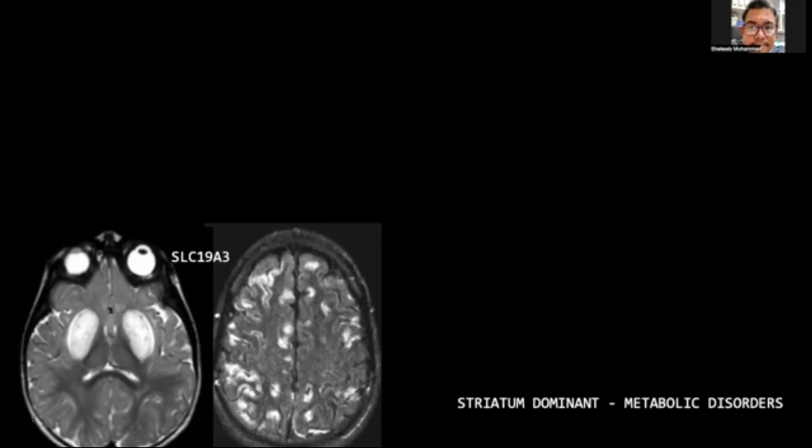In terms of the neostriatum, we have looked at some encephalitic examples, but what about neurometabolic disorders that have a predilection for the neostriatum? An important one to remember is biotin-thiamine responsive basal ganglia disease. And don't forget this pattern. It's very rare, but this is a treatable disorder and outcomes can be very good if treated on time. Again, you may see swelling of the neostriatum along with this very unusual but typical cortical highlighting, either on T2-weighted or diffusion-weighted imaging.